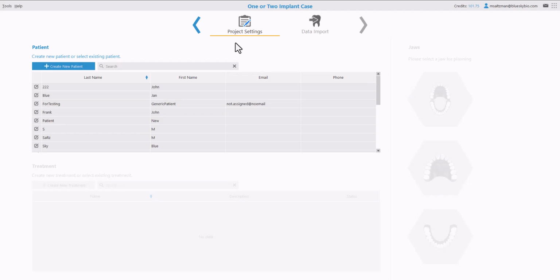We have introduced new functionality to automatically organize your data by patient and the relevant patient treatment. So we could see the screen that comes up in the BlueSkyPlan software. This is true for all of our digital products. So whether you're using BlueSkyPlan, LabPronto, BioBigBox, BlueSky Monitoring, your data will be organized by your patient and the patient's treatment across the digital platforms.